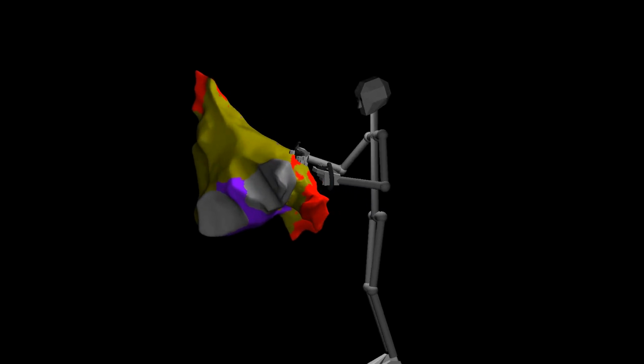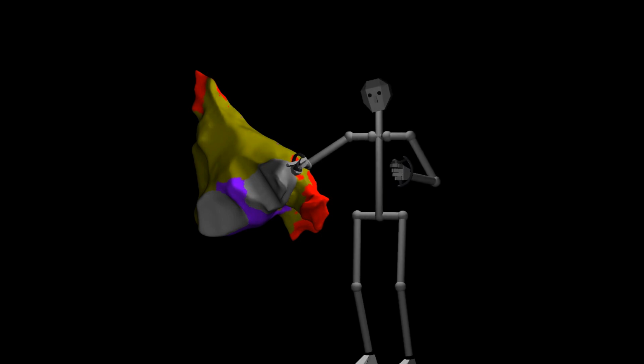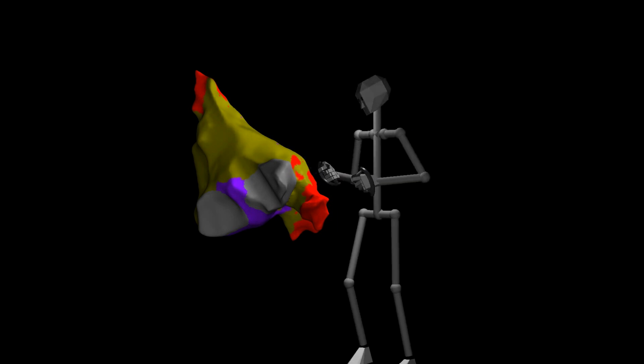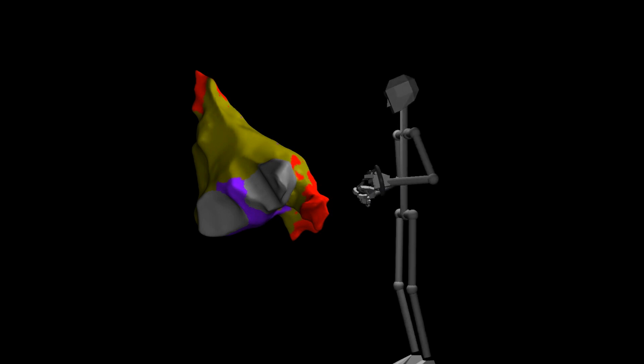This gray area down here means that for some reason there was no voltage data collected, even though the surface itself was probed, which is why we have the 3D shapes, but we don't have the color mapping because no voltages were recorded. I do not know the reason for that, so we just draw those in gray.